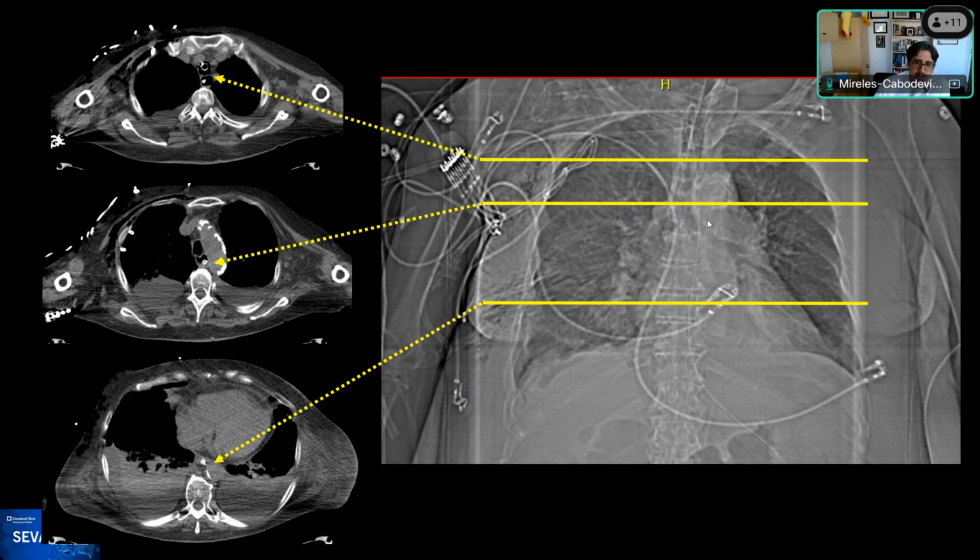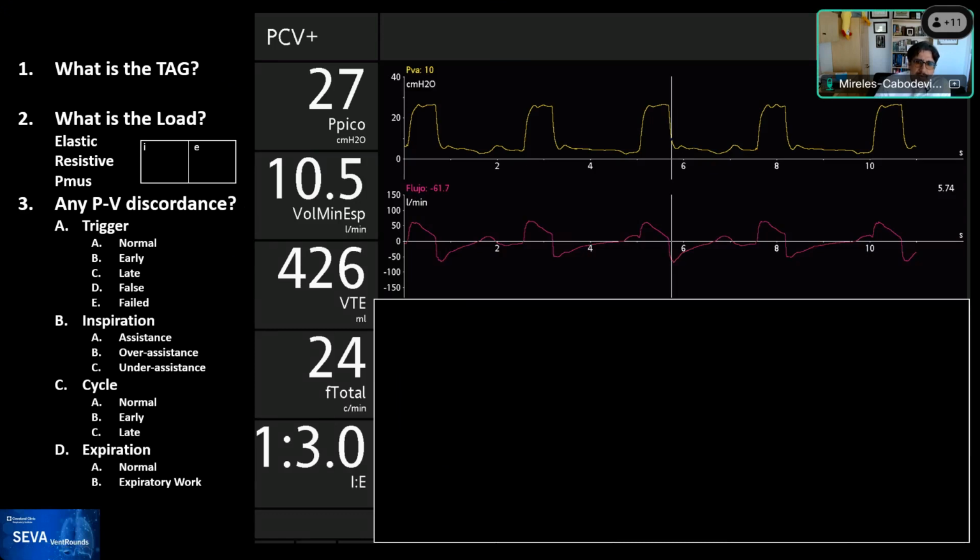but it's just important to point out to you the close relationship of the esophagus with the pleural space, and that's how we use this as a surrogate because of the flexibility of the esophagus and the transmission of the signal. All right. So here's the waveform, and as a good citizen, we decided to block the esophageal pressure so that first we can read the waveforms over here.